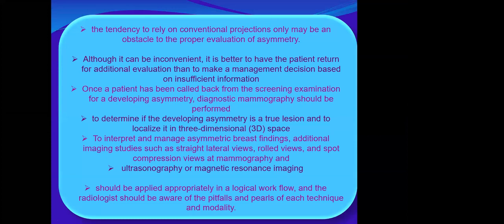However, the tendency to rely on these conventional projections only might result in obstacles for proper evaluation of asymmetry. The breast might be too dense, and you cannot totally depend on that to say this is an asymmetry. It is helpful, but we cannot completely depend on it to exclude a real lesion, or it might be a focal asymmetry also.